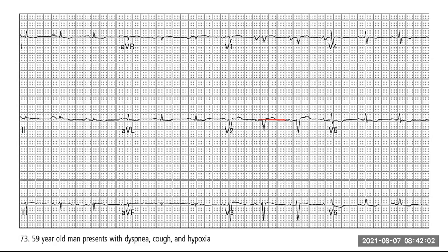Agreed. So in other words, we'd have to tie this to what we're seeing in the patient. Agreed. And we'd have to marry the two. But just looking at our ECG, what would you be worried about? CCF, LRTIs, pleural effusions, not so much pericardial effusions because they look a bit different. We'd be worried about right heart as well. Agreed. So we've got quite a few differentials. All right. So how are you going to investigate this patient? That's the question.